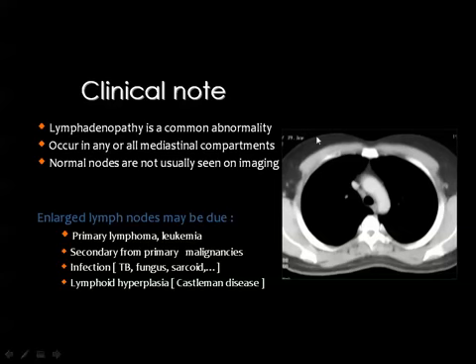And if you see here, this is a scan, and you see the arch of the aorta and the superior vena cava, and you see a slightly enlarged lymph node posterior to the superior vena cava, what we call the retrocaval lymph node. And we usually advise our candidates not to consider this lymph node as pathological unless you have a clinical evidence of disease. Like if the patient is known to have a primary malignancy, you consider it.